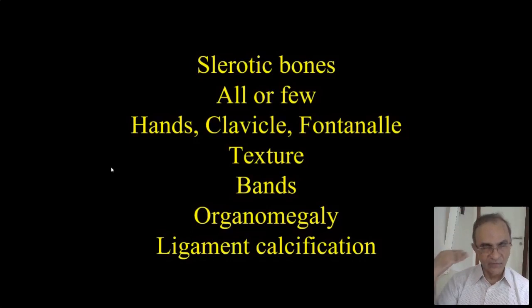All bones affected, very likely skeletal dysplasia. Patchy bone affection, coarse trabecular pattern, one is fluorosis, the other is secondary hyperparathyroidism. All bones affected and increased bone density would be a skeletal dysplasia, and ligament calcification separates secondary hyperparathyroidism from fluorosis, which both have coarse trabecular pattern. So if you have increased bone density, I repeat, increased bone density, abnormal trabecular pattern which is coarse, you have a metabolic bone disease on your hands.